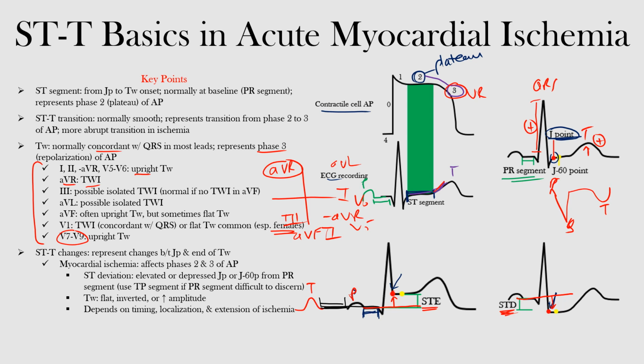Now, sometimes the J60 point is also suggested to be used, such as in the setting of exercise stress testing. So just so you're aware what the J60 point is, that's this one. Let me just erase some of this here so you can see. It's that here in yellow. That's the J60 point, and it's this point here, 60 meaning 60 milliseconds after the J point. So our J point counts 60 milliseconds after. This is something we can use, and again, that's in yellow here. This is usually used in exercise stress testing. So just something so you're aware of if you hear about it.